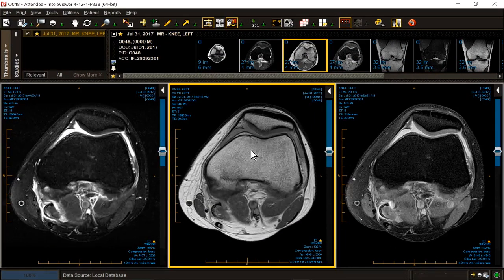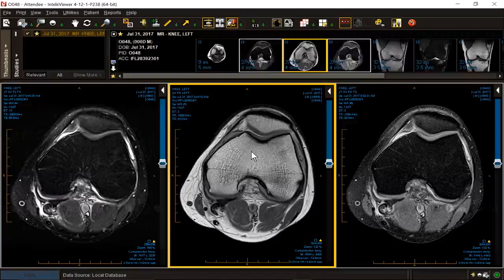This is a PD without fat suppression. It is not a T1. What should that mean to you? Long TR, short TE, looks T1, but it isn't T1. It means you will miss bone lesions on this series. Do not use this series to look for edema, fractures, tumors, other.